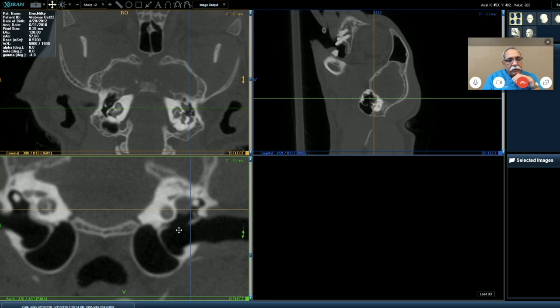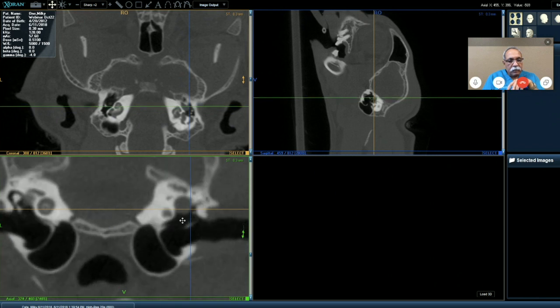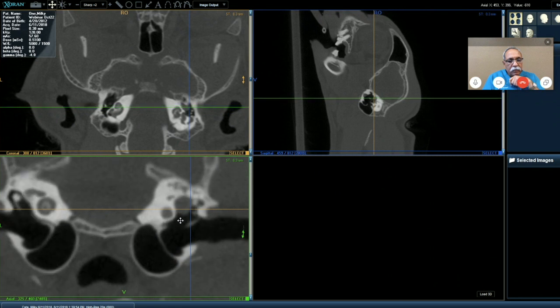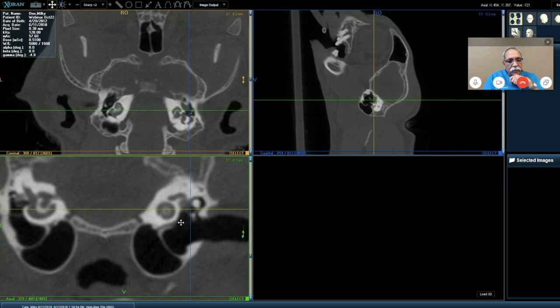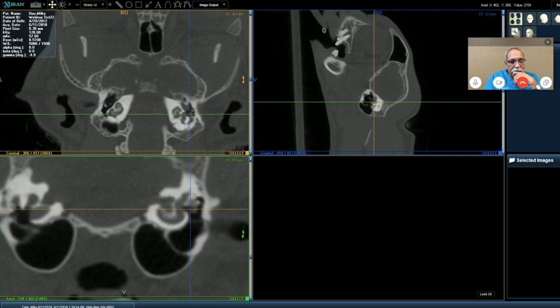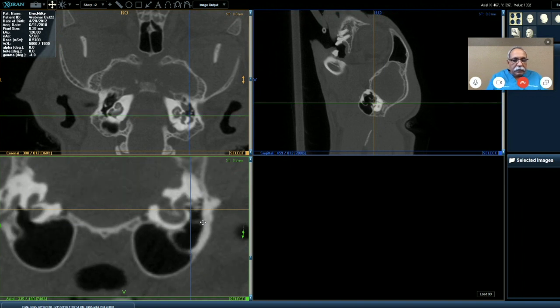Cochlea is also connected to semicircular canals. And if you scroll a little bit, you will see the 3 semicircular ear canals in there. Scroll a little bit. Probably go the other way. A little bit more. Right there, there's 2 semicircular ear canal. You can see between. It's not very clear still. Scroll a little bit further up. There is one right left to the cursor. Right here, the dark one. It looks like a rabbit ear. So there is 3 semicircular ear canal that you are going to see.